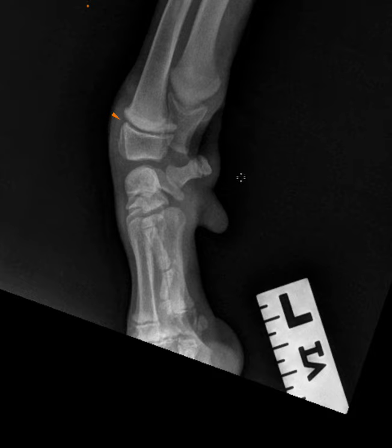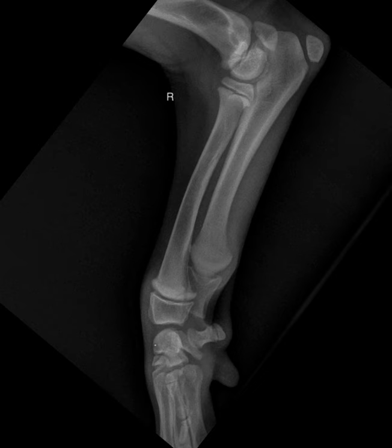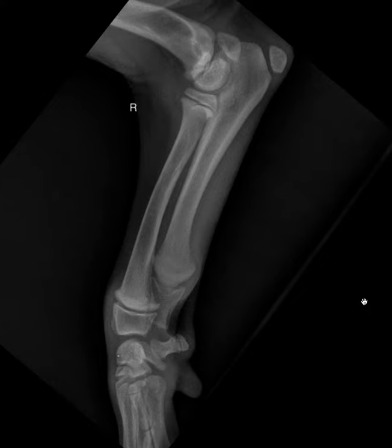Well, let's get oriented to start with. I'm going to switch to the other limb and orient ourselves with the anatomy, which is another thing that can kind of jump off the radiograph as being a little bit dramatic or different when we start to look at puppies. So here we have multiple physes proximally. This one that I'm showing you here is probably one of the easiest to identify. This is the ossification center of the olecranon, or olecranon, depending on how you like to say that.